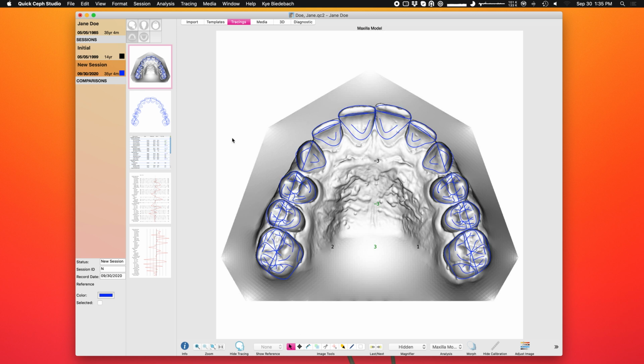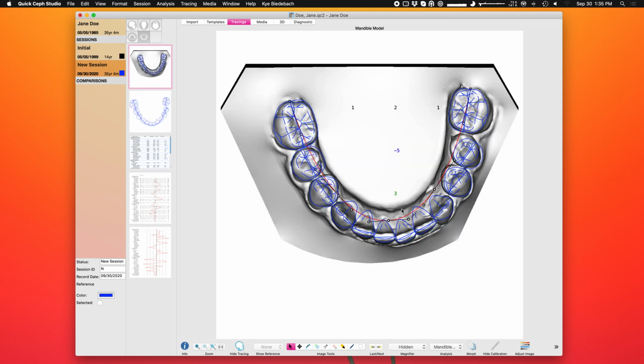Okay. And on the mandible, you have your curve. It starts as a catenary curve. If you just grab this main circle, it moves right into spot, and it stays as a catenary curve. Now, depending on the jawline, you can adjust that more, and you see it moves in unison. This is now a Bezier curve you can adjust, and it moves in unison.